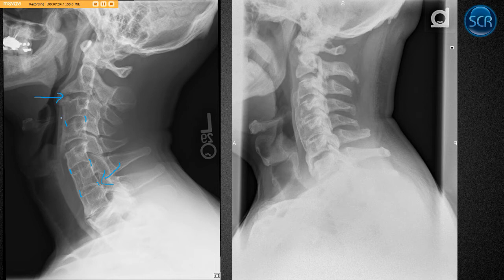They become hypermobile. They build osteophytes and get all this hypertrophic change. You could say, well, what the heck? The facets aren't fused in this case. So this guy's quite young, very active. I think he's like a 30-year-old active surfer and things like that. So he's doing a lot of stuff. Facets haven't quite made the fusion trip yet. These ones down here are probably fused. But yeah, he does have a few open ones. And you could say, well, this one looks fused.